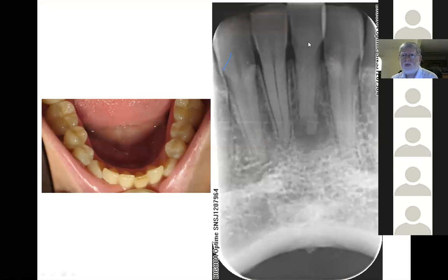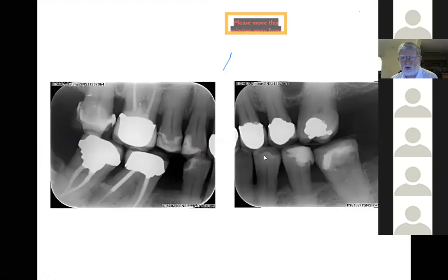Again, trauma, the canals become very, very fine, but there's a large periapical lesion. So when you're seeing discolored teeth, palpate the sulcus, push against the tooth, question about any symptoms. May be wise to take a radiograph to make sure that there isn't anything like this going on. You can get chronic pathology and the patients don't know about it.